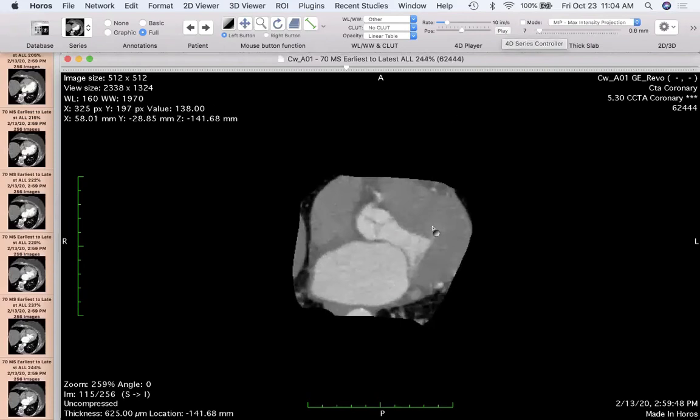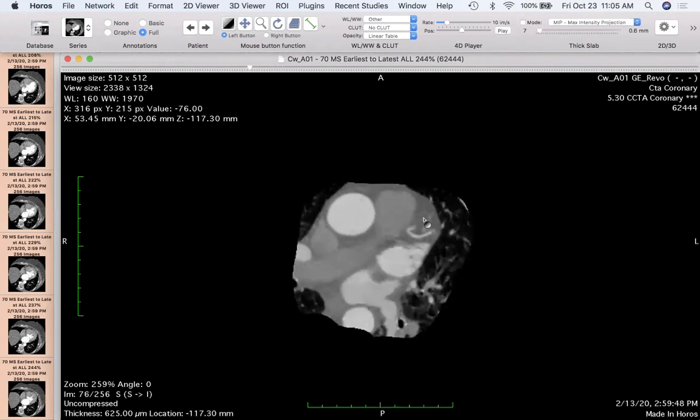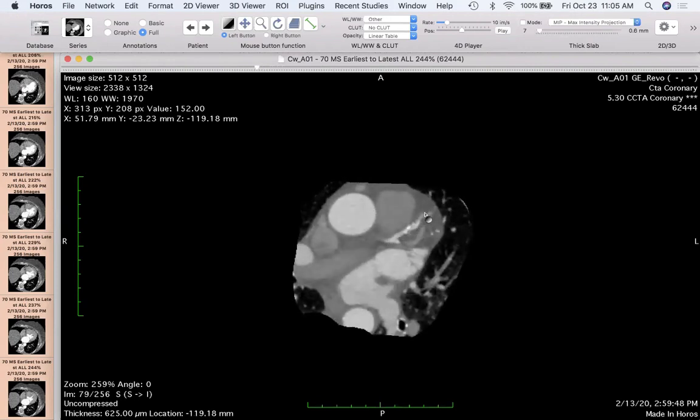But it would be interesting because then you'd be able to use the 3D space segmentation editor, which is powerful, right? Because it seems to have edited across all time frames, for one thing. And you can see features in 3D that are very difficult to edit in 2D, right? But one way of isolating features in 2D, and you guys will want to sort of isolate probably this feature, right? This is the coronary artery and the tissue around it, right?